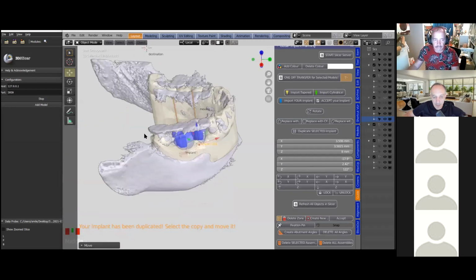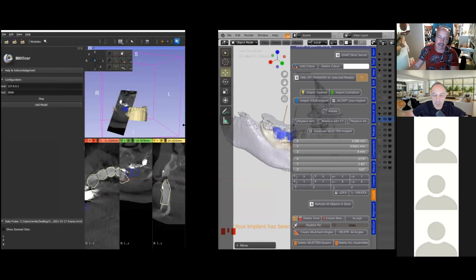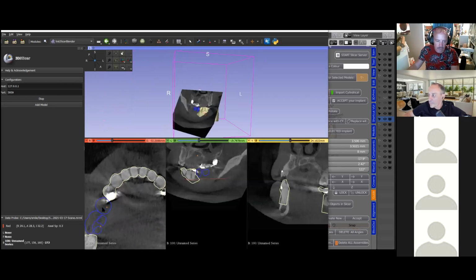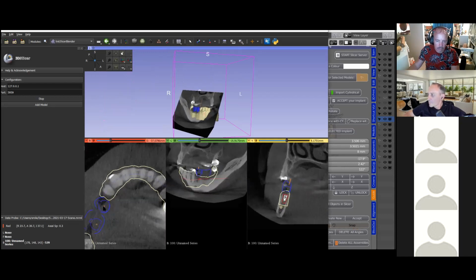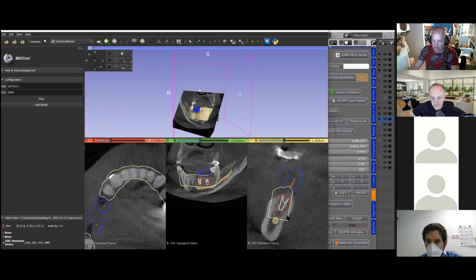Okay. So knowing now we've placed it there, chances are it's in a good position in our 3D Slicer. But we've got to verify that to see whether this is in fact true or not. So I'm going to zoom in, hold shift, and move your mouse to actually view what's going on. Okay, so here we've got one, and then we've got the other one over here. Okay, so already that's looking okay.